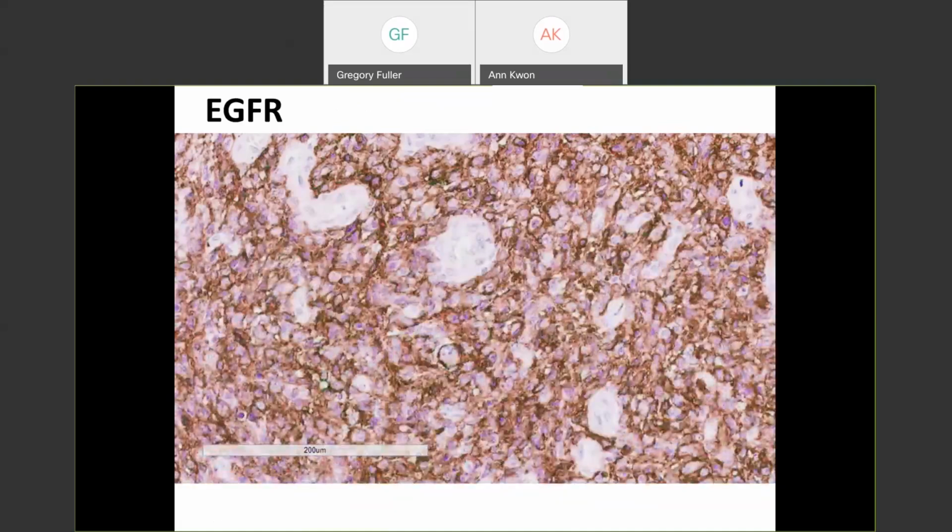Look at the EGFR behaving as expected. You can see the blood vessels, the vascular proliferation, sort of painted in negative relief. It's a good way to see the vascular proliferation, actually, in cases which do have EGFR overexpression. Look at this beautiful membranous pattern as well as cytoplasmic. This is 3+ overexpression of EGFR. It does not have to be due to amplification, but frequently it is, and that's what we're really interested in because EGFR amplification is a signature which is overwhelmingly associated with glioblastoma.